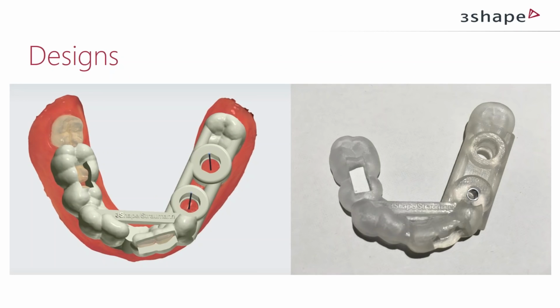We, of course, can see a guide in many different ways, taking all these principles that we just saw into consideration. This is a typical guide which has a good area to cover.